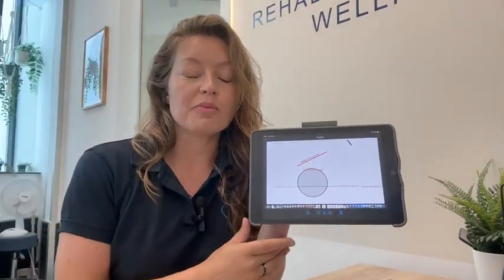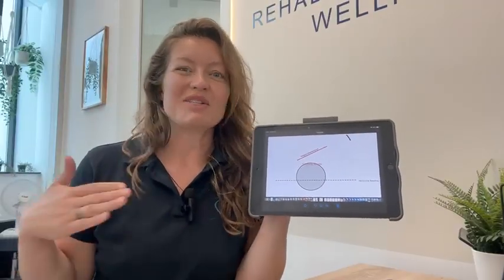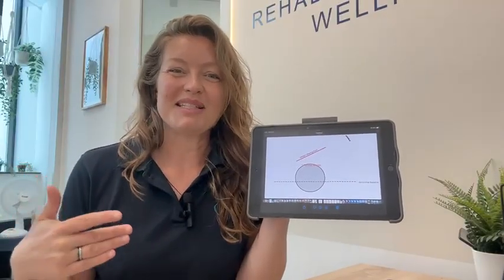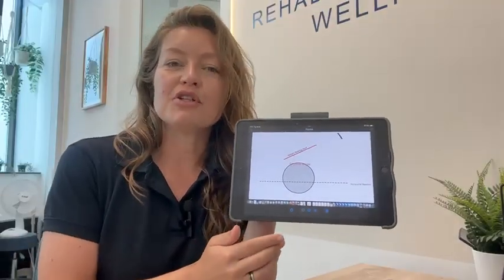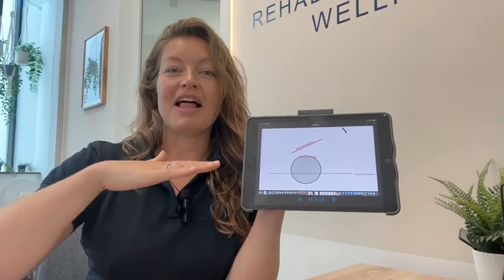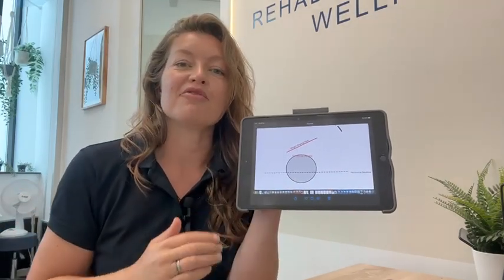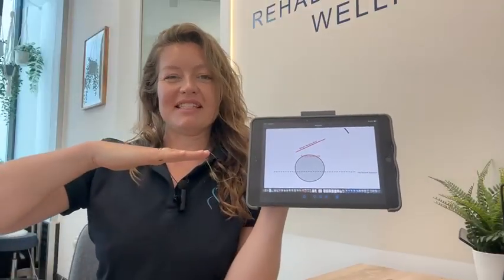This is one of the other options, but again, really useful to understand what these words are when they're floating around when you're going in for these appointments. So what they will have to do for this one is to take a picture of the whole pelvis and determine a level height. So that's what this line is below here. So it's establishing a baseline for what angle your pelvis is sitting in neutral.